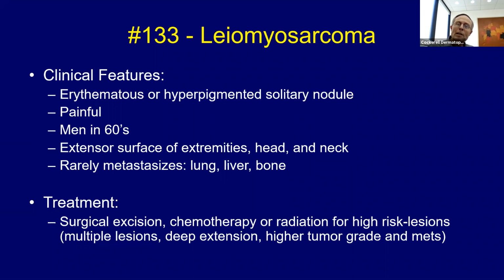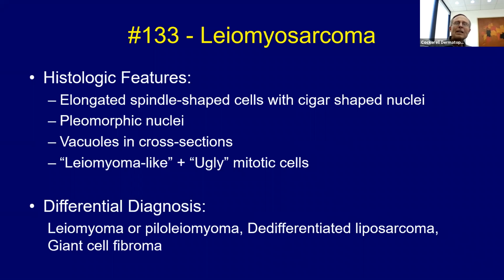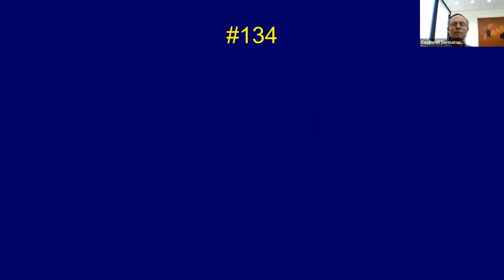So they rarely metastasize. Now, if they've got a very marked number of mitotic figures, anaplastic, et cetera, maybe you think about that. But when it looks like this, with a few atypical cells and whatnot, you basically just treat it almost like a squamous cell carcinoma, or like a primary melanoma, and you just cut it out, and the patients really do very well.